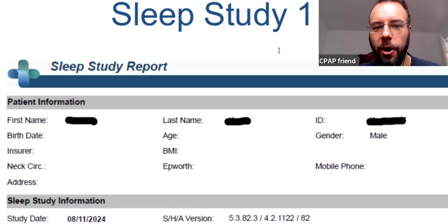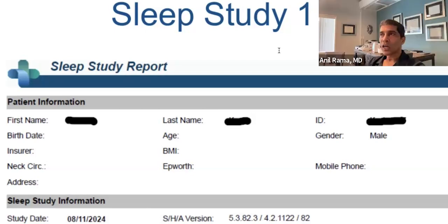And this is actually the report that spits out, and you add your diagnosis and recommendations. Okay, interesting. So it's all auto-generated. It's all auto-generated, and the study is auto-scored. Basically, it's scored by AI, whatever proprietary algorithm they have. And honestly, I've probably overseen 50 to 100,000 WatchPATs in the 20 years I've been overseeing this product.